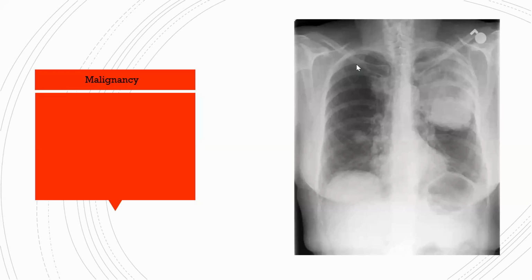Right shoulder. So here, there's a big abnormality, clearly. Increased airspace shadowing, massively. So it could be tumor, definitely. It could be a pneumonia, or a pneumonia around a tumor, because tumors love attracting pneumonias around them. So actually, it could be more complicated than that. The tumor has pneumonia around it. But as far as you're concerned, the main abnormality in this X-ray is there's probably a large tumor here, and possibly some metastases on the contralateral side. Okay.